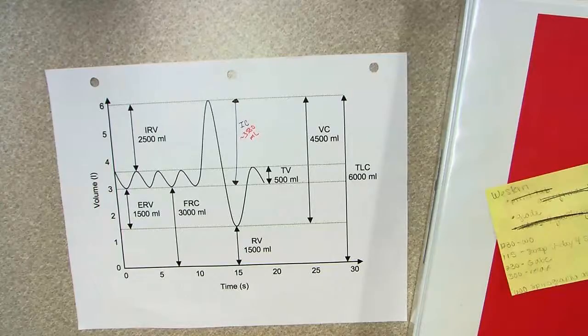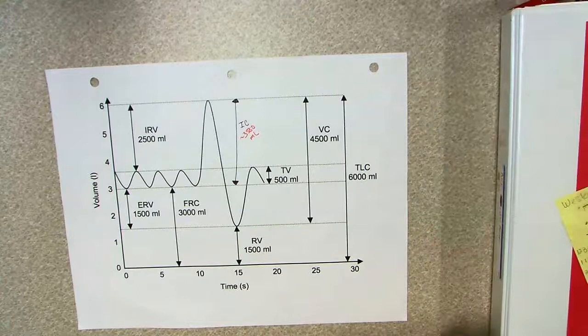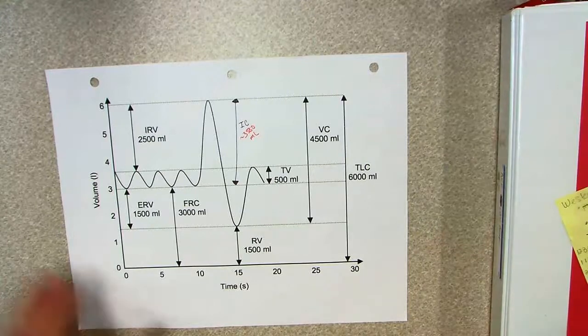Good morning. In this lecture video, we're going to go over the spirogram and what we can learn about lung volumes and lung capacity by looking at it. So if you look here, we can tell a couple different things by looking at a spirograph.